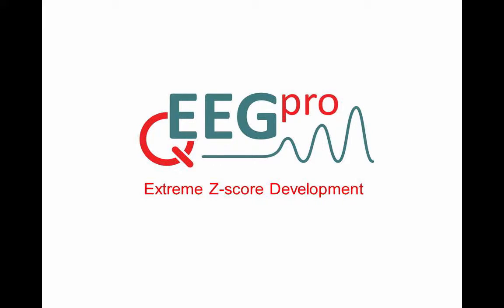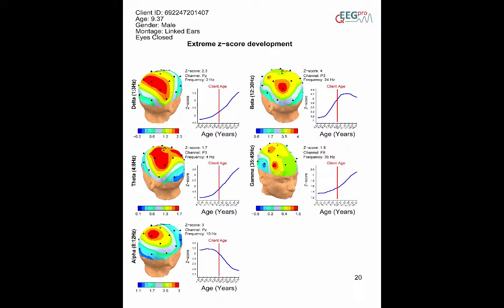Extreme Z-score development. The extreme Z-score development analysis is based on absolute power deviances and consists of two parts. On the left plot, the Z-scored absolute power of the most extreme Z-score within a frequency band is plotted on a three-dimensional head. Let's focus on the upper left corner of the example page.